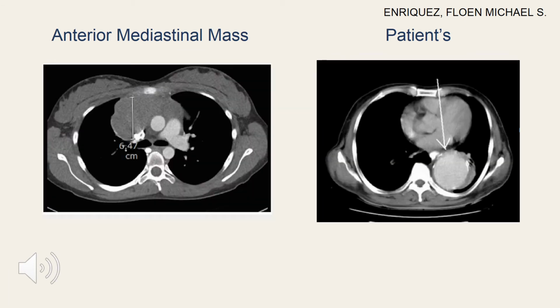So this slide just shows us that the mass of the patient is definitely not from the anterior mediastinum. But we can take this opportunity to compare the CT scan of a patient with anterior mediastinal mass as seen with the left picture.